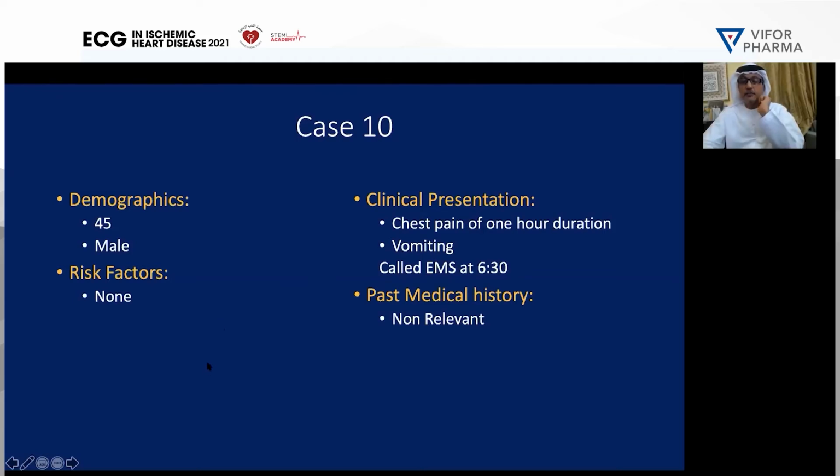Yes, definitely. One of the things with these patients, acute coronary syndrome, is we take a focused history. But yes, a lot of times when you dig deep, you find they're hyperlipidemic, hypertensive, and diabetic, but they don't check. So the first time they find out is the acute MI, and then you find that they have all the risk factors there. So let's move to the tracing.